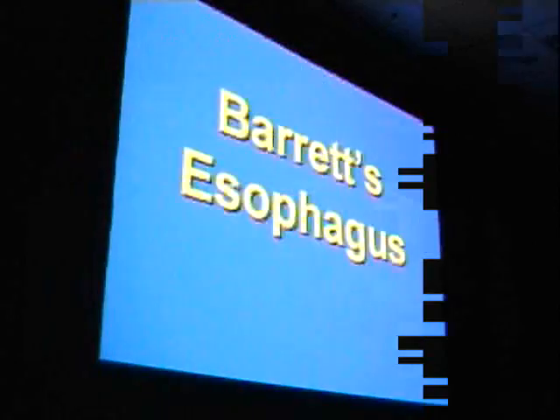Multiple little teeny aphthoid ulcers here. There's a differential for this, obviously, which I've given you, and this turned out to be due to reflux. Could this be herpes? Absolutely. Could this be Crohn's disease? Absolutely. Could this be Behcet syndrome? Yes. It could even be CMV, even though CMV, as I mentioned, tends to give us bigger ulcers.